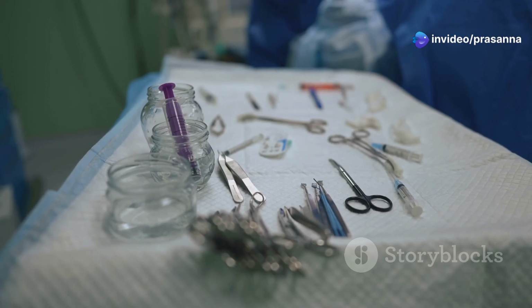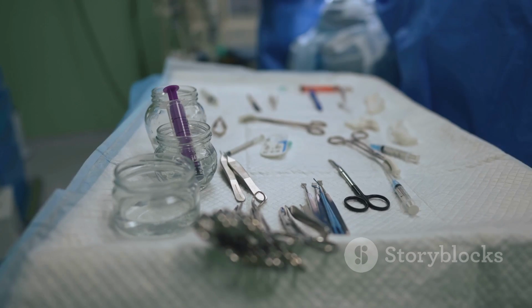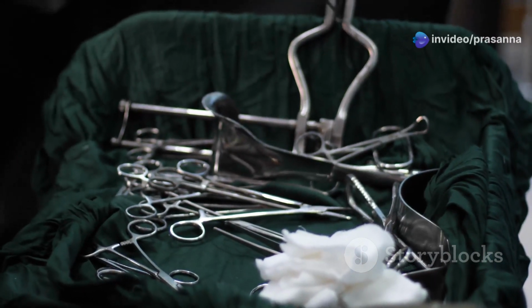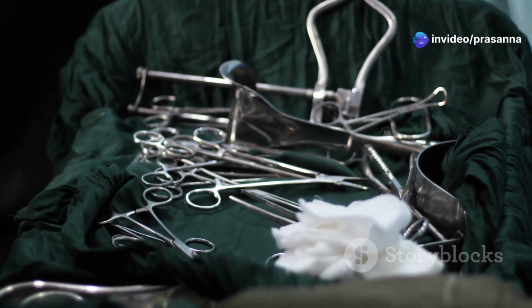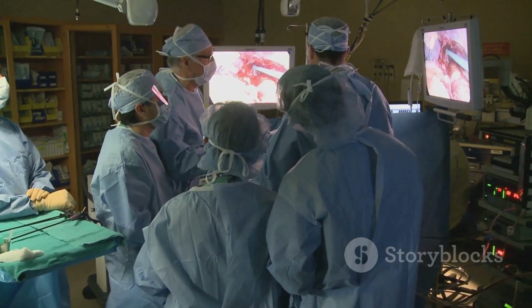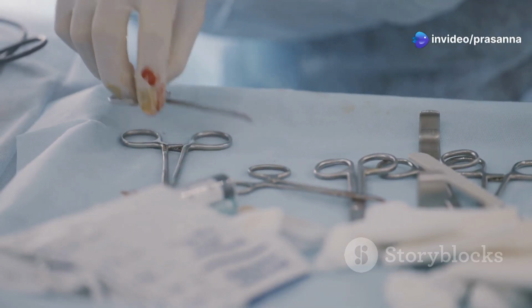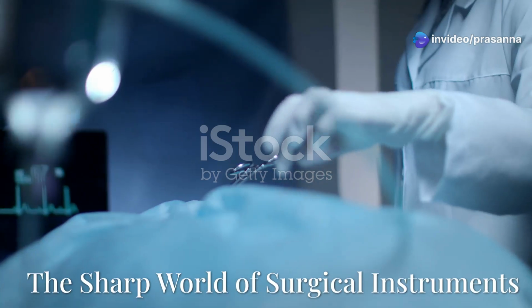Understanding the basic categories of surgical instruments and their specific uses is essential for anyone interested in the world of medicine. This exploration into the realm of surgical instruments will delve into the most common types, providing a glimpse into their functions and importance in various surgical procedures. Whether you are a curious mind eager to learn more about the medical field, or a prospective medical student, this journey promises to be both insightful and fascinating.